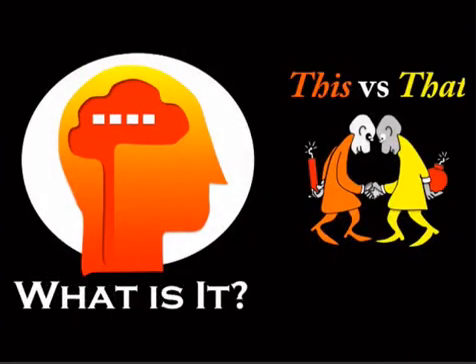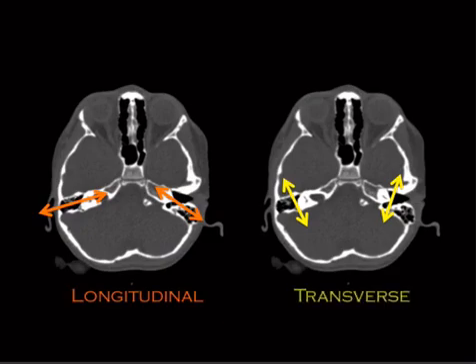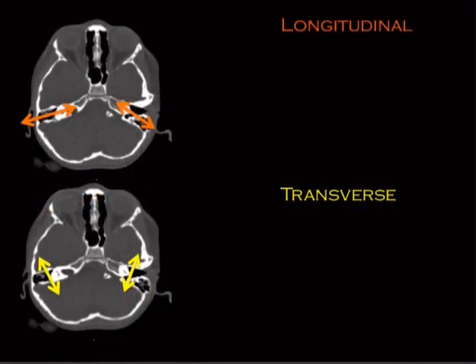Another comparative case here in this setting of trauma. Old school people like to classify temporal bone fractures as either longitudinal or transverse based on the direction of the fracture plane. Now, this is silly, right? Because reality is the majority of the time that's complex and sort of multi-directional, but you'll see lots of textbooks break them down, and there's some really excellent ways to ask multiple choice questions about this. So let's run through that.